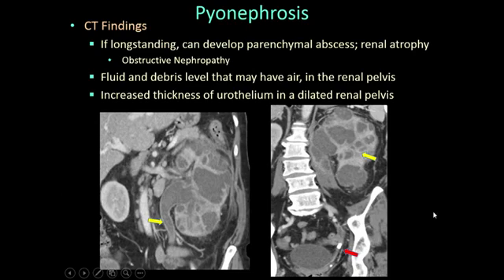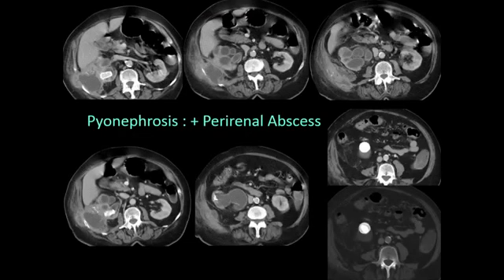If you were to put them on CT, this is what they may look like, a very ugly collecting system. There's peripheral enhancement, urothelial enhancement to the obstruction. This happened to be a long-standing stone in this older patient that sat with it to get superimposed bacteremia and urosepsis. So what happens when you have these long-standing infections and obstruction? It can cause significant disease to that kidney, where the kidney becomes atrophic. You can see that this one has significant dilatation in the collecting system, a large stone that is obstructing this kidney for a long time.